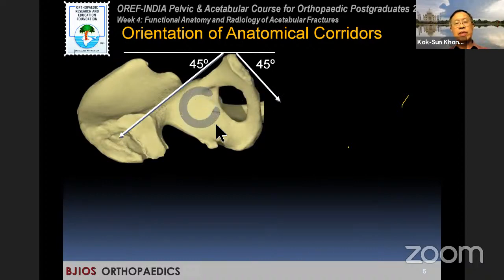The acetabulum is within this area. Of course, it's hidden if you are intrapelvic. But the sciatic notch and the obturator foramen are there, so injuries around here can affect the area of the obturator foramen. The screws that are placed in the rami are screws that secure your plate. They can secure the posterior and the anterior part of the plate.